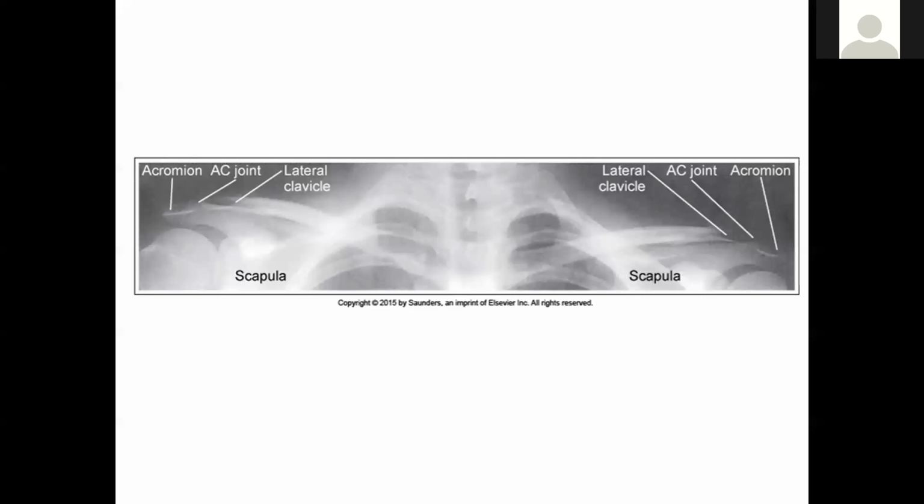This image is fairly grainy, but you can see the acromion, the AC joint, clavicle on the right side, and kind of burned out over here. But the collimation is very good. Your area of interest for these exams are the AC joints. So you don't need a shoulder series. You don't need to irradiate the neck as much. You can collimate fairly tightly around the range of the clavicle, and you'll get both joints on there.